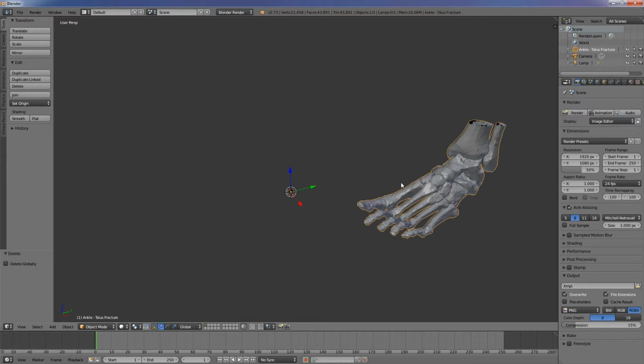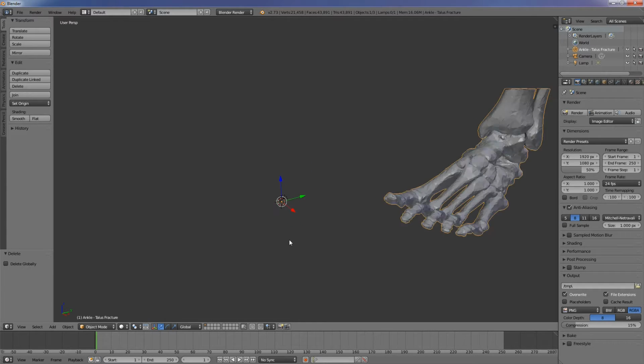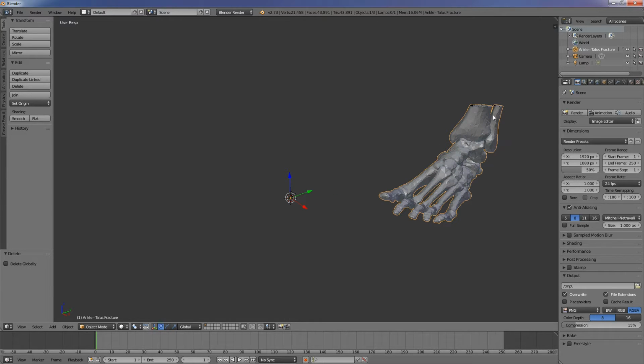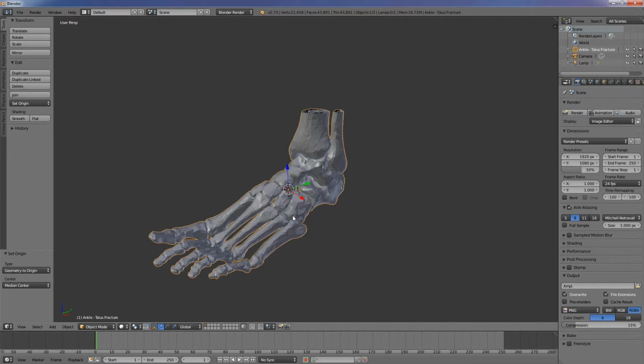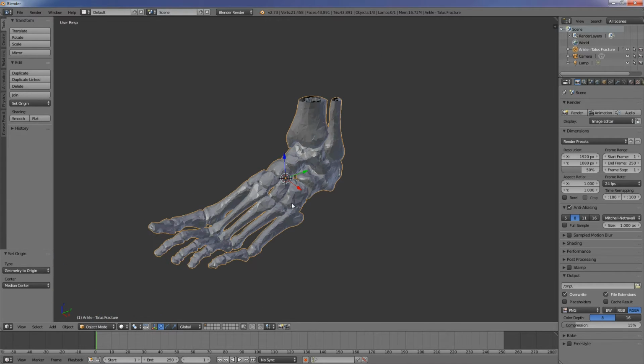This can be very irritating because if we're trying to zoom in on an object or rotate and have it orbit, it's sometimes a little difficult to manipulate. So let's recenter the geometry of this ankle onto our origin. Go to the Object menu, select Transform, Geometry to Origin, and now our ankle is centered along the origin of the scene.